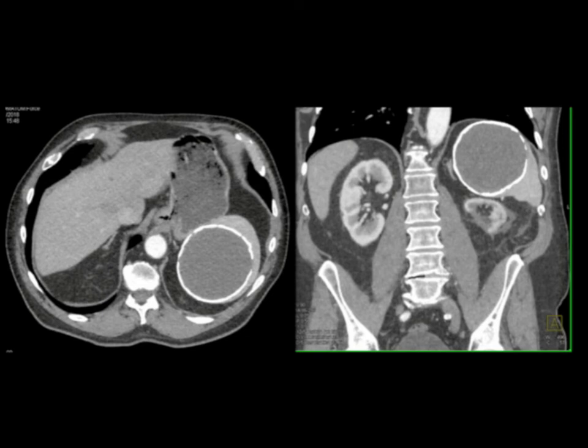Angiosarcomas can have calcifications, but they're hypervascular lesions, enlarge and infiltrate the spleen, not the case. Lymphoma doesn't calcify unless it's radiated, and I've never seen anything with a big cyst like this looking like lymphoma. Hemangiomas, commonest lesion in the spleen, but they don't calcify. This is a benign calcified splenic cyst.